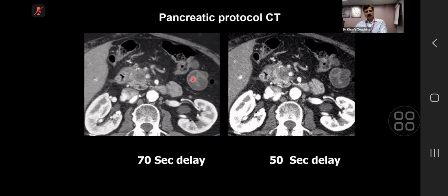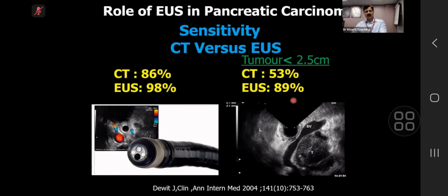So first of all, this is a case to make the point that this is a 70-second delay and this is a 50-second delay, and you can see that the parenchyma is enhancing better, and you can see the tumor is better seen. Having said that, nobody does it.